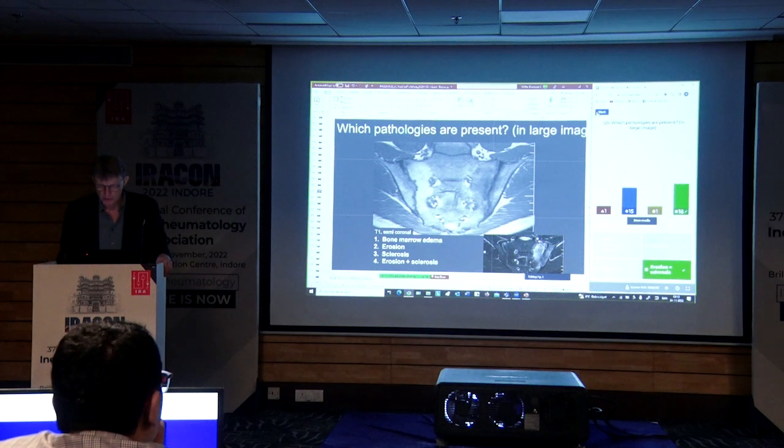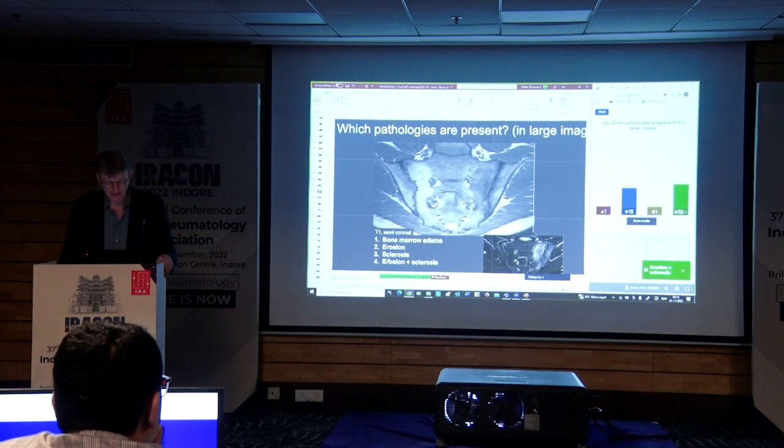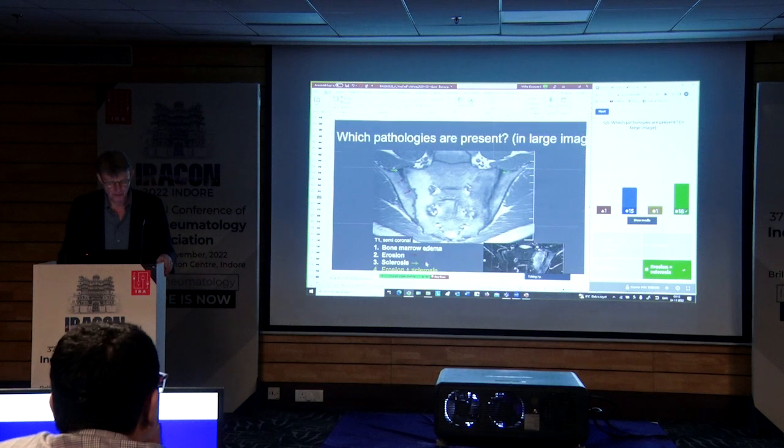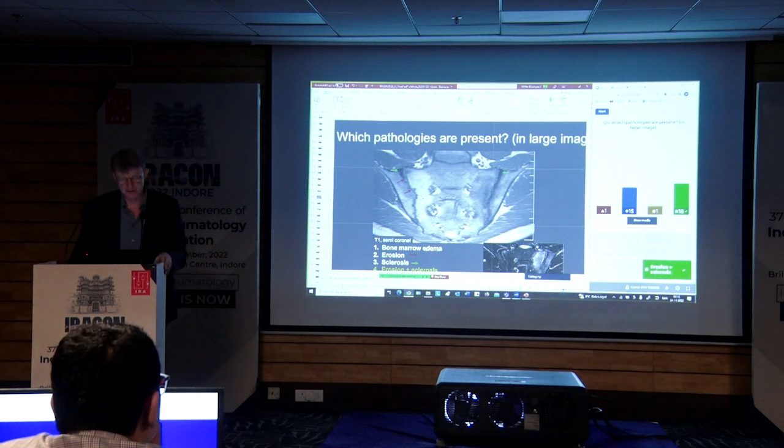Right, and you answer the two logical reasons, and I think both are good answers, because almost all of you say that there's erosion, and then some say that there's also sclerosis. And I haven't mentioned sclerosis much, to be honest. I said that it was black on all sequences, and you do also see sclerosis. But the main thing here is the erosions that you see at different locations, indicating structural damage.